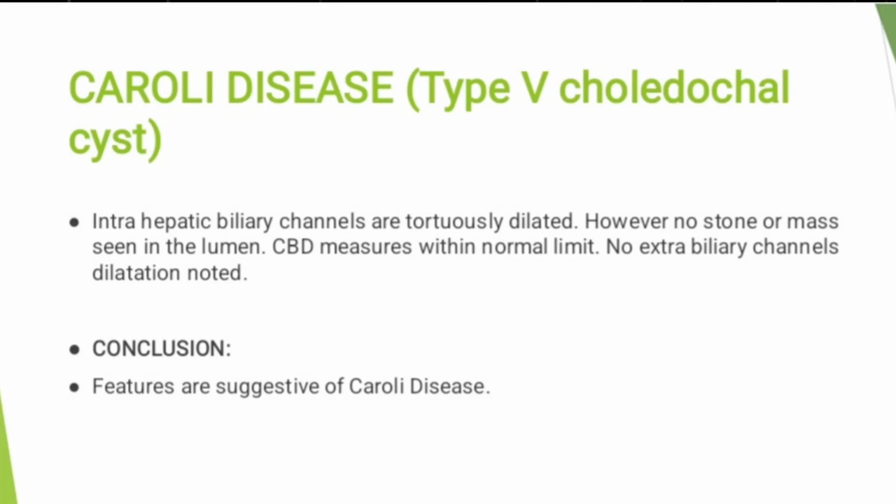The report would be like this: intrahepatic biliary channels are tortuously dilated. However, no stone or mass is seen in the lumen. CBD measures within normal limits. No extrahepatic biliary channels are dilated. So the conclusion would be that features are suggestive of Caroli disease.